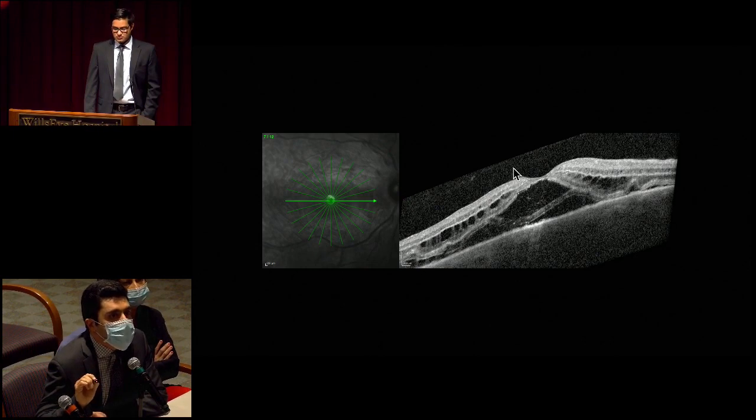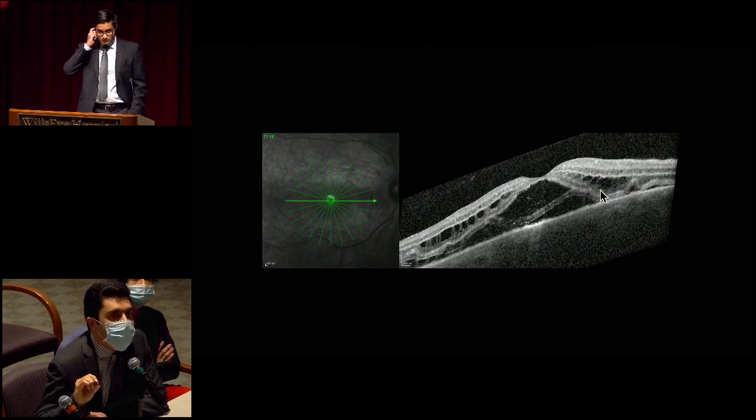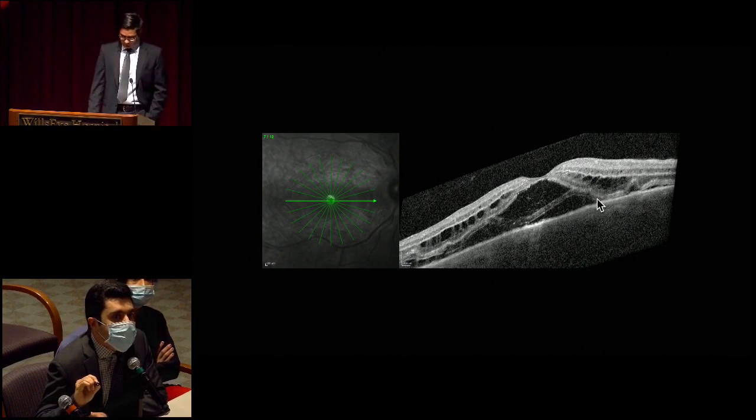The vitreous appears optically clear. The choroid has, there's not a lot of definition of the choroidal vasculature here. It doesn't look like a normal choroid to me, and that was suggested from the prior imaging as well. Looking at the actual retinal layers, the inner retinal layers seem to be a little more intact. However, there is a little bit of loss of definition between the layers itself, maybe owing to this intraretinal fluid and edema that's going on. In addition, we see this large area of subretinal fluid as well, and some disorganization of the outer retinal layers.